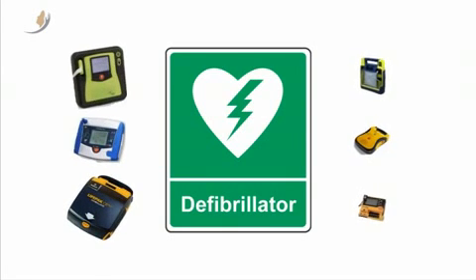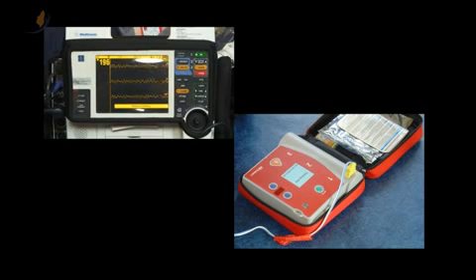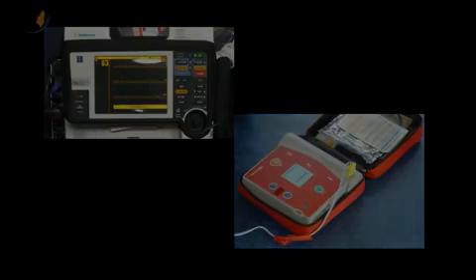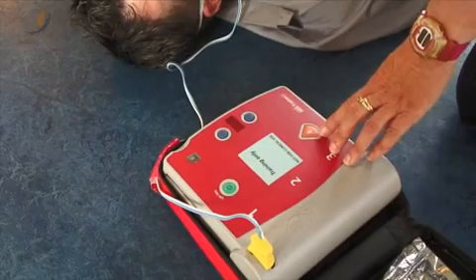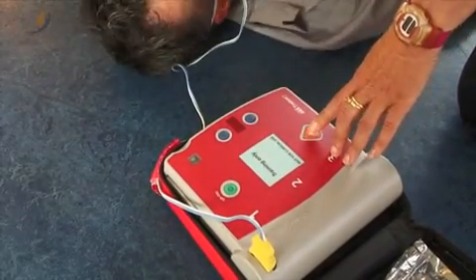There are many brands of AEDs, and the Pre-Hospital Emergency Care Council does not endorse any one brand. Although AEDs may differ slightly, the same steps are used to operate all AEDs. Each AED has a voice prompt which will guide you through the process.